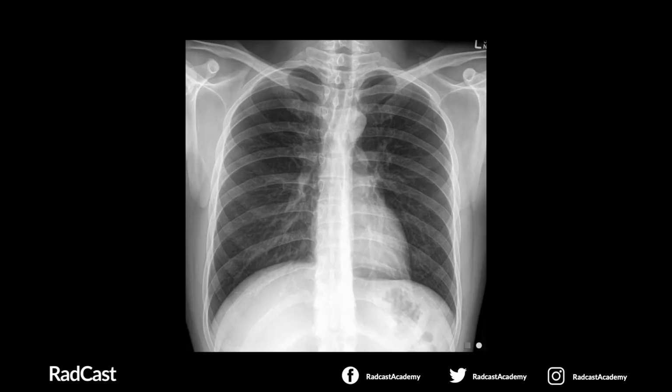So let's use a normal chest X-ray to illustrate how we would go through the details in the RIPE. So details, we would make sure we've got the correct name, date of birth, age, and gender of the patient. We would make a reference as to what type of film it is. We would then make sure that the correct marker is on the correct side of the patient. So here in this case, we could see that the L marker in the top right-hand corner is on the left side of the patient, and that we've got the correct date and time of the chest X-ray we want to look at. So we will assume that all of that is correct for this chest X-ray.